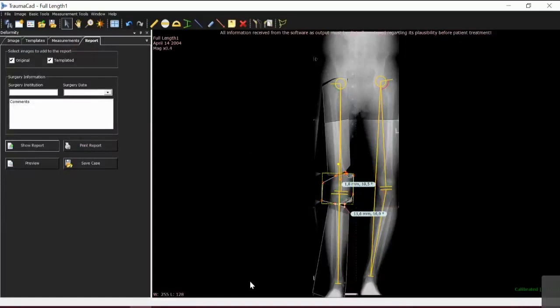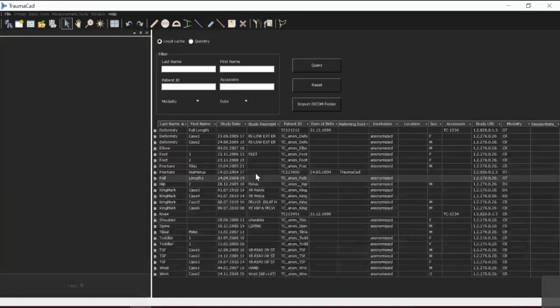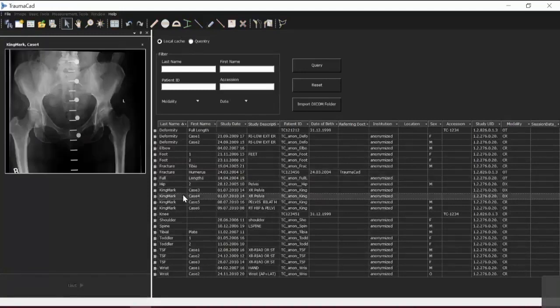As you know, with the hip case, we may well be looking at femoral impingement. So it just so happens that I don't actually have a lateral view on this particular case, but you're absolutely correct. If there was a lateral view below here, we could launch both views, and then we can actually plan in both views to look at the femoral impingement or the alpha angle, so we can do that as well.